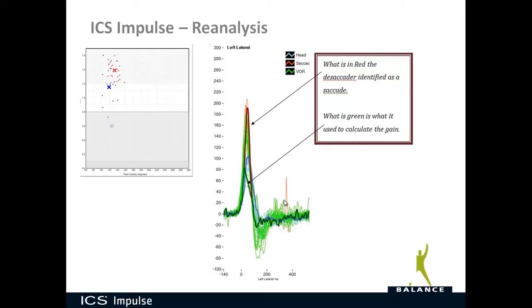of what looks like a covert saccade right on the top of the peak of the head movement. So why does this look like a covert saccade? It's a very steep, or what Ian Curthoys would call a stalactite type of shape. So a very steep, pointy shape. And that's what we typically see with saccades. It's not a very broad shape or kind of rounded off. It's very steep and pointy. So that's what the algorithm looks for: is there a catch-up saccade there?